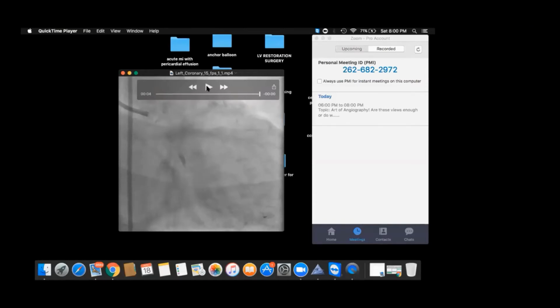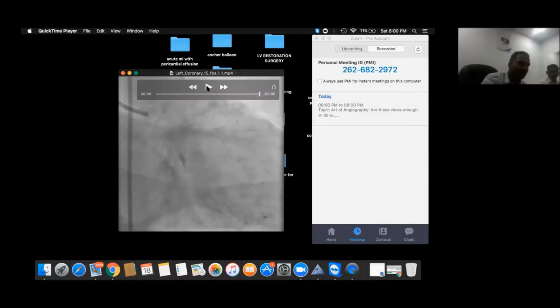So it's basically an underfilled vessel. Yes. We don't know whether it is an underfilled vessel or it is a diffuse disease. Say it is diffusely diseased. What do you do? Would you love to send this patient to the bypass surgeon? No.